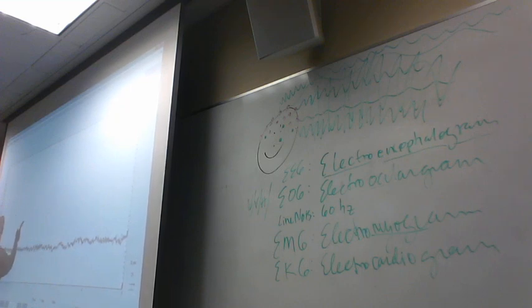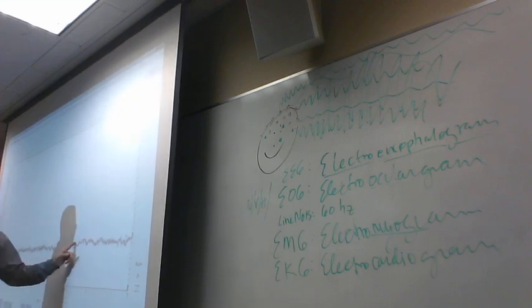So remember we said, in our GUI, we have one epoch. But what we're going to do is demolish that. We're going to slice that pizza into 300 slices. So we have 300 trials of memory experiences in our experiment. So we need to slice the single one long trace into 300 slices.